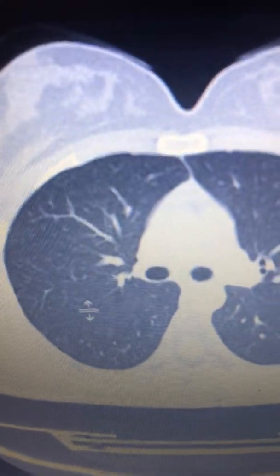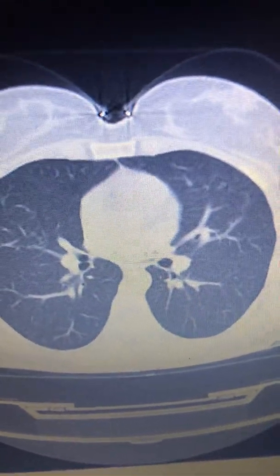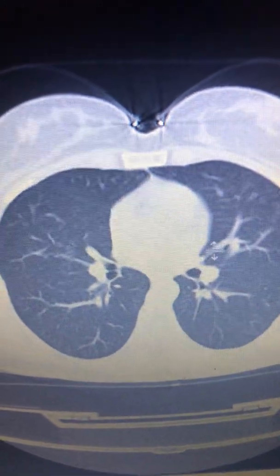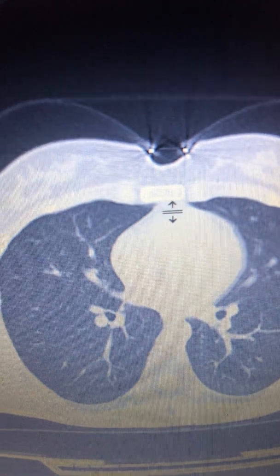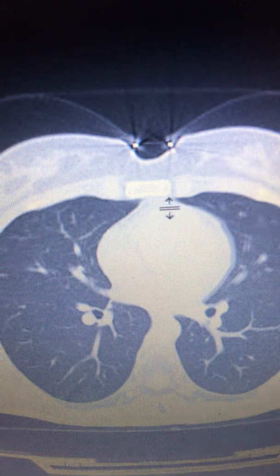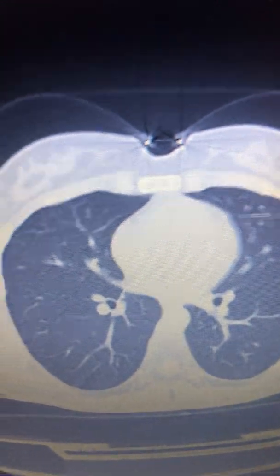Anyways, I'm going on showing the remaining parts. As it can be seen here very easily, the heart tissue, the heart itself is being seen, and I'm going downwards. The main sternum, the main bone in front of the chest, supporting the ribs, right side and left side.